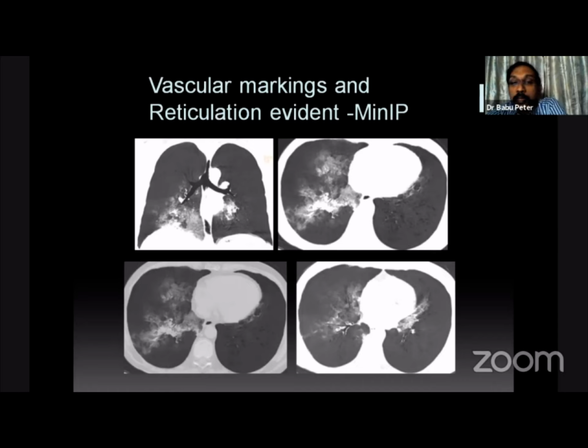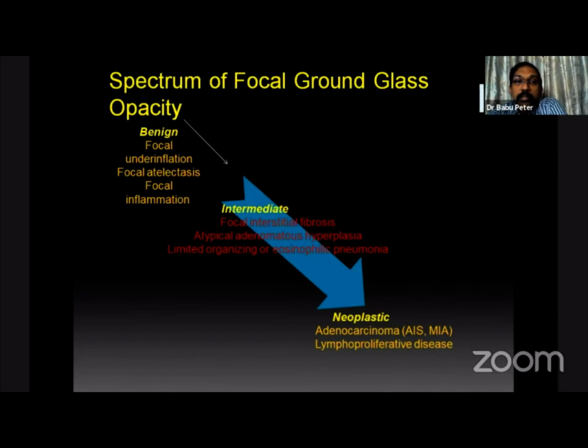So you can load it into 3D MPR and differentiate where the nodules are discrete in the coronal and sagittal images, whereas the vascular structures may follow the vessels in the coronal and sagittal images. And moving on to the next spectrum of ground glass, which is focal.